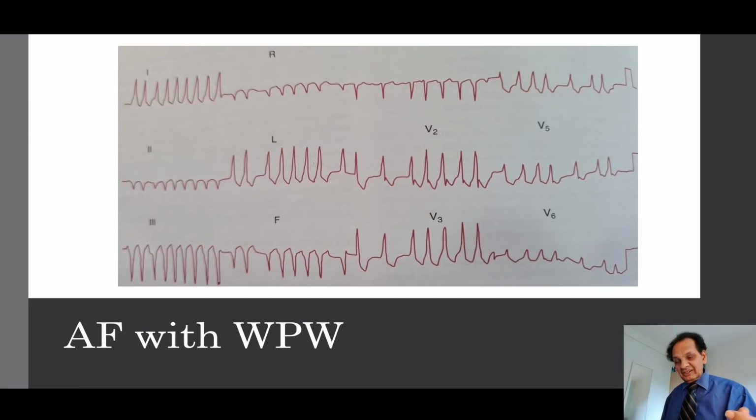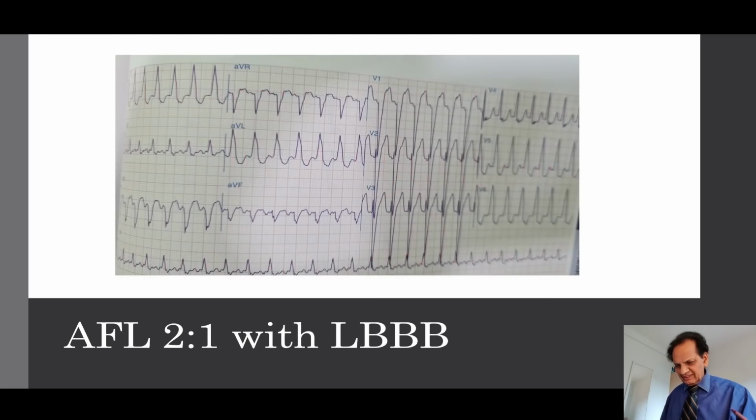Again AF with WPW, to emphasize to you that it is a very dangerous rhythm. Never give AV nodal blocking agents, because then all the atrial waves will be transmitted to the ventricle through the bypass tract. Very important ECG again.